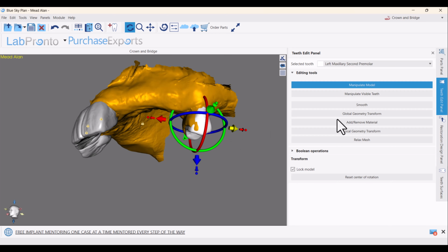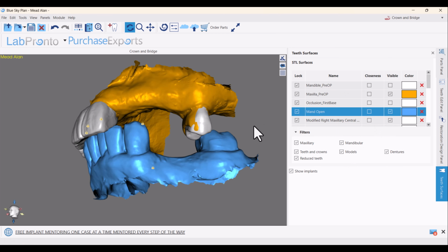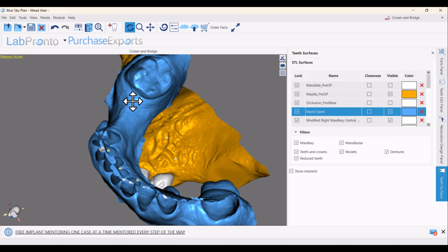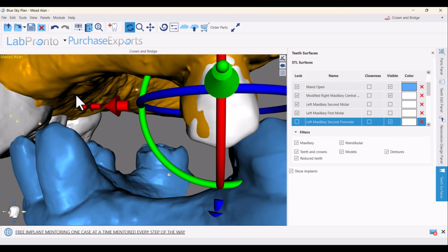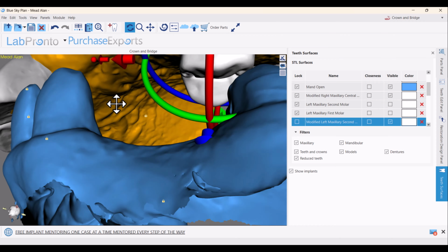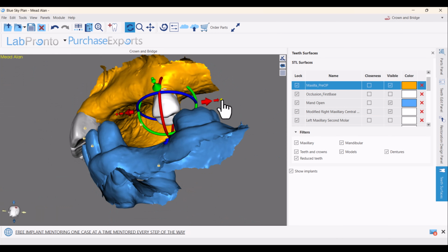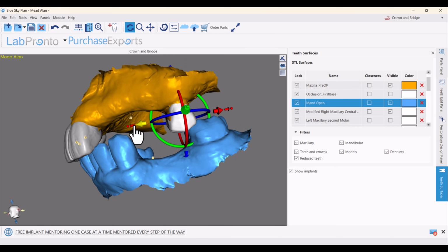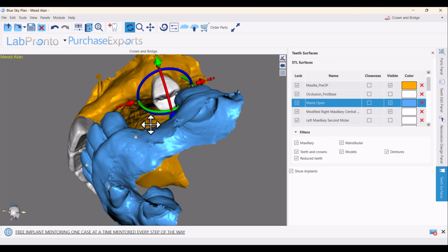All right, let's see what that looks like against the bottom here. I haven't looked at the lower model at all. Remember, that's so few teeth here. Who cares about the bite? Honestly, go figure it out. The patient's already got a weird bite anyway right now. What's really going to change it, to make it a little more weird, right?